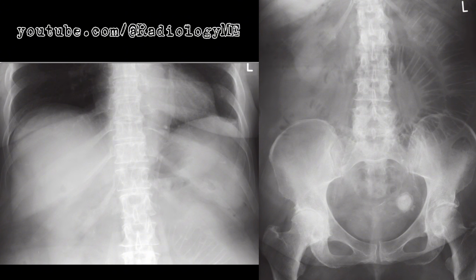As for the next steps, while a CT scan could help confirm the diagnosis, identify the location of the obstruction, and guide surgical management, sometimes the findings on plain radiographs are compelling enough to discuss urgent intervention with the surgical team. In conclusion, while this case is quite telling with the evidence at hand, never hesitate to follow through with a clear and open conversation with your clinical team.